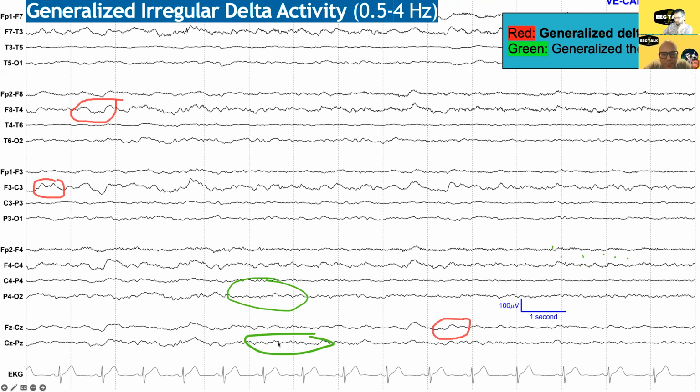So that's a question I always get. What if you have frequencies in different ranges on the same waveforms? Which one do you go off by? Well, for encephalopathy grading, we're still doing some research on this, but I think we're going to find that it's best to describe them all, because you definitely see some EEGs where there really isn't any alpha activity.